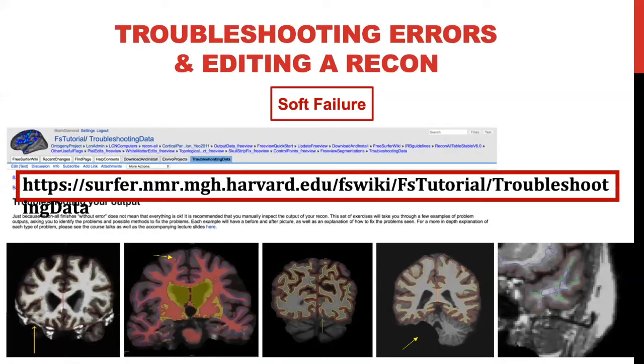Now, since we're transitioning into identifying certain errors, certain soft failures, and applying certain edits to fix them, we have this really nice tutorial on our wiki where you can make changes to example data or to your own data. This tutorial will walk you step by step on what to do.